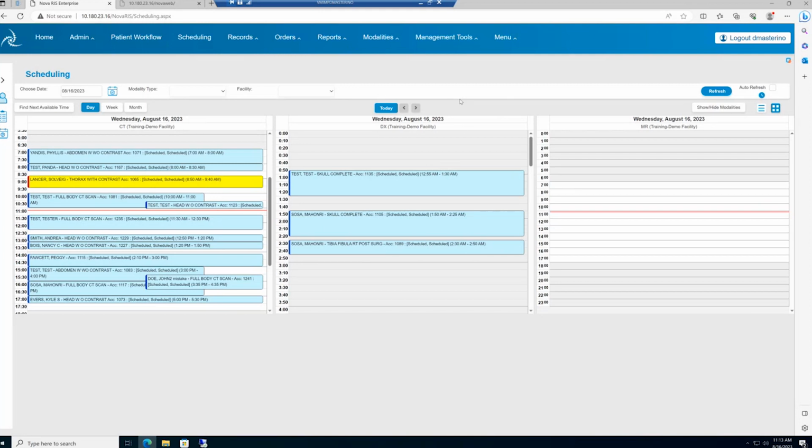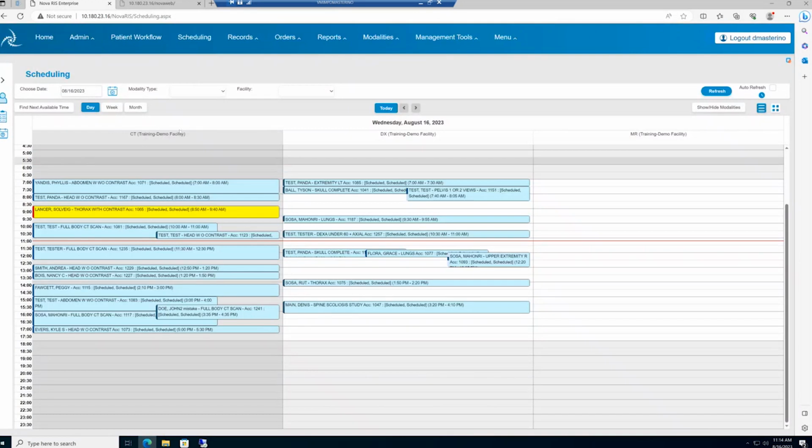That is something that you can do by user. So a user can choose to do that. This is not an admin feature. So someone who finds this helpful can set their screen up this way. Whereas if it is simpler for someone else to just show the single view, they can make that choice as well.